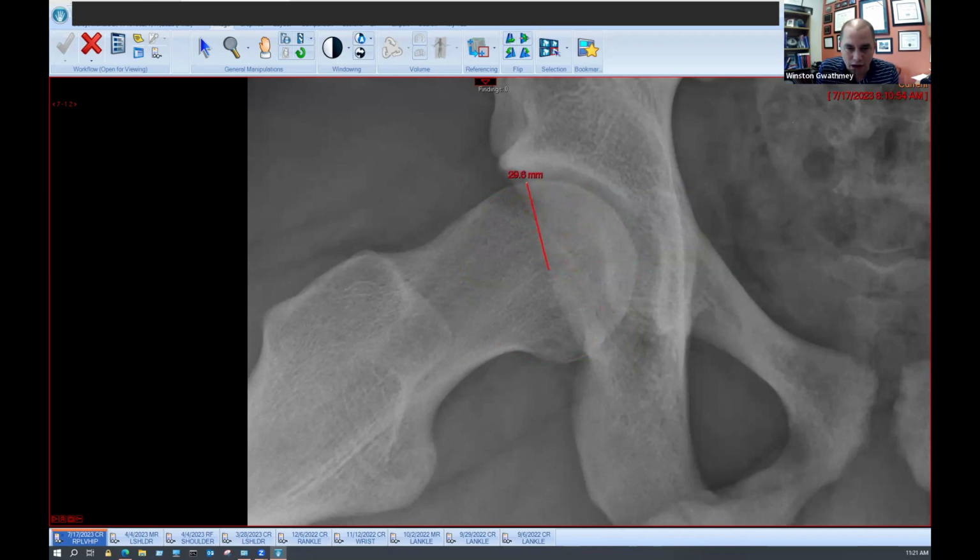So if you think about how a femoral deformity works, when the radius starts increasing beyond what the acetabulum can accommodate, that's what's going to cause your cam type impingement. So you can see right along this whole area right here, the radius of his femoral head and neck is going to be 31, 32, 33, all the way down to here, 34. So if you think about it, the acetabulum is a fixed volume. If you're trying to shove all this bone up in the acetabulum, you're going to get disease. You're going to get damage within the actual acetabulum. So just keep that in mind. That's how FAI works. You're basically trying to stuff all this bone into the acetabulum, and it can't accommodate that. That's why you get this loss of cartilage, okay?